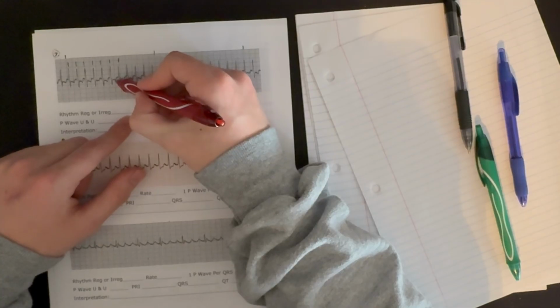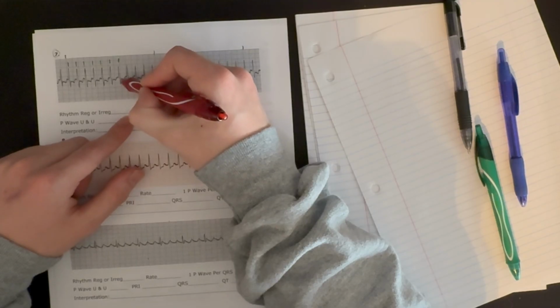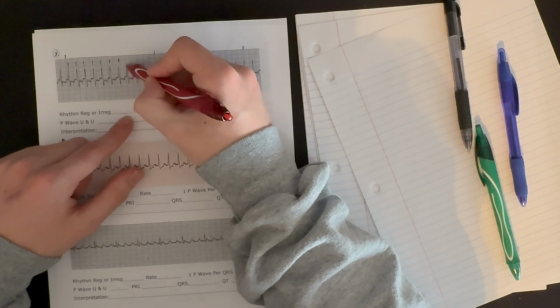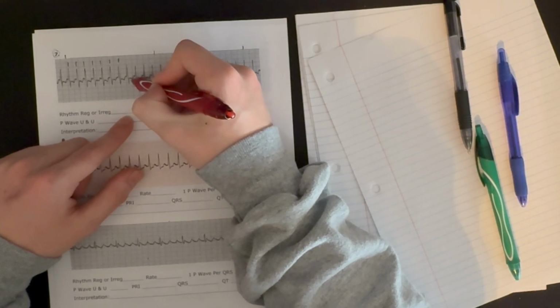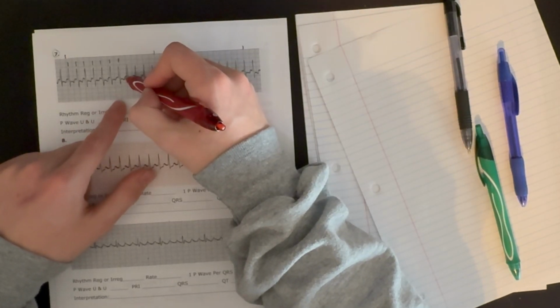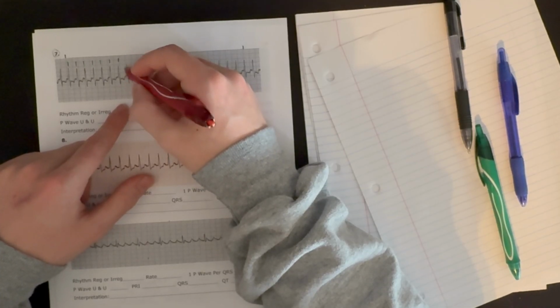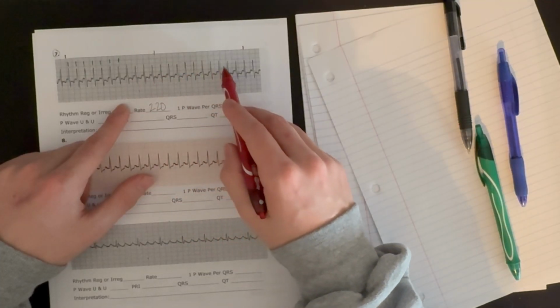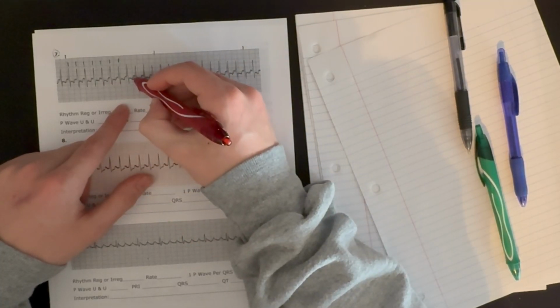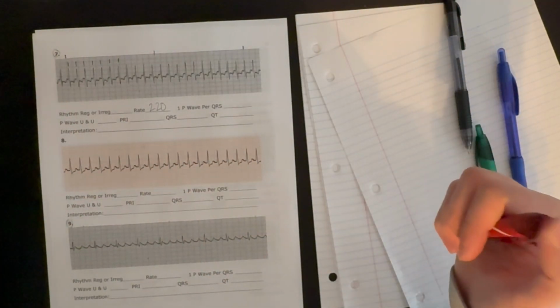Starting here, we have our P wave right here, followed by our QRS complex, ST segment, T wave, right into the next P wave, QRS complex, ST segment, T wave, right into the next P wave, QRS complex. So there is a P wave, this upward deflection, and it's coming basically at the same time as, or at the end of, our T wave. The timing is very short, and that's a result of this really, really fast heart rate. The T wave is actually inverted here. That's not important, but it is something we note.